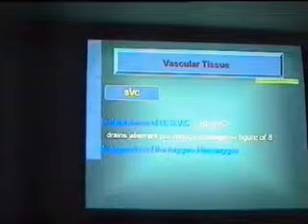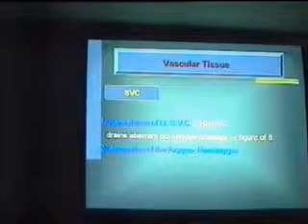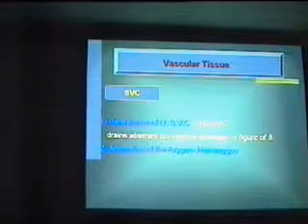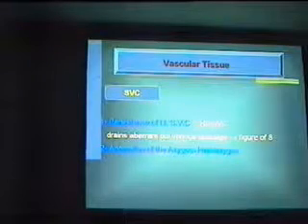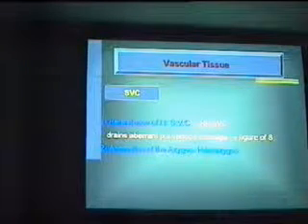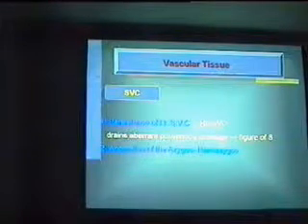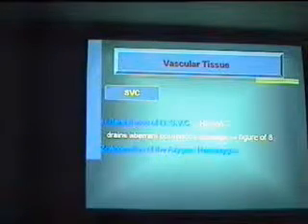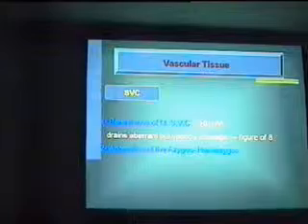نيجي للسوبيريور فينا كافا ونقول إن أهم مشاكل في السوبيريور فينا كافا هي persistence of the left superior vena cava. إحنا عارفين إن بيبقى عندي left ورايت، والليفت تذوب ويفضل لي الرايت، فسمتايمز يحصل لي persistent left superior vena cava either with or without right superior vena cava. أوكي؟ يعني يبقى عندي زي الدبل أورتيك آرش كده دبل superior vena cava، أو يبقى عندي left without the right. And the persistence of the left superior vena cava drains aberrant pulmonary venous drainage، وده سبب الفيجر أوف 8. يعني على الرايت سايد بيبقى عندي البلمونري، على الليفت سايد بيبقى عندي السوبيريور. أو يبقى عندي anomalies of the azygous or the hemiazygous veins.